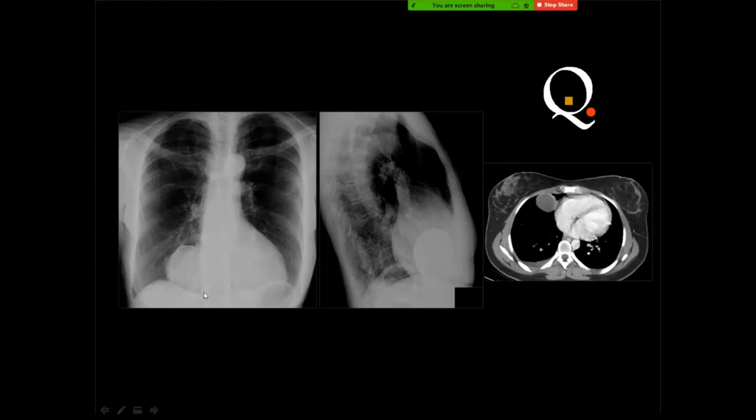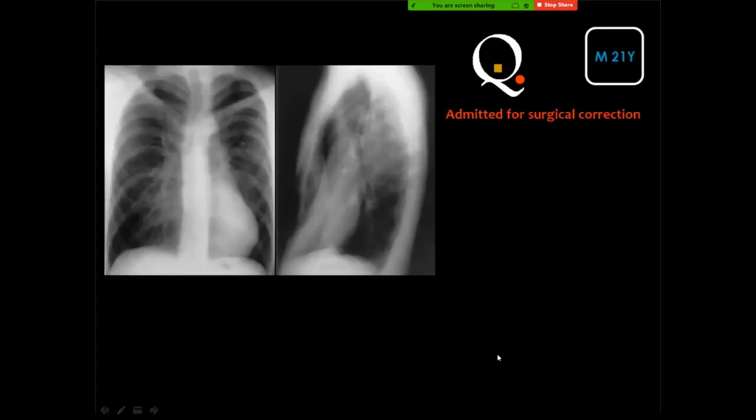place is almost reserved for the pleuropericardial cyst, and you know that this cyst contains fluid density and it can show some marginal calcification. And you should remember that hydatid cysts in the lung do not calcify, and this is not a pulmonary lesion but is a mediastinal pathology, and you see that the patient also had a pleural effusion. The right answer, yes.